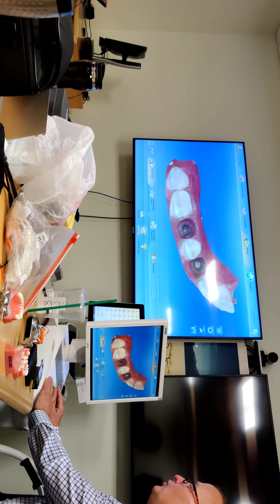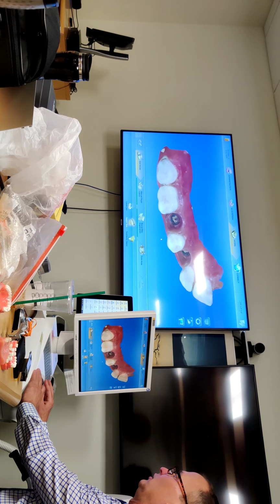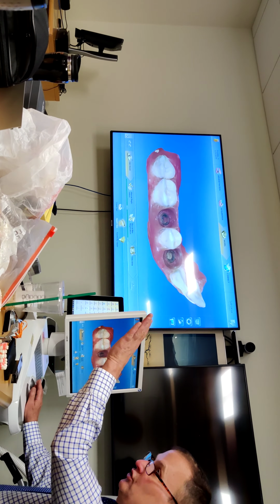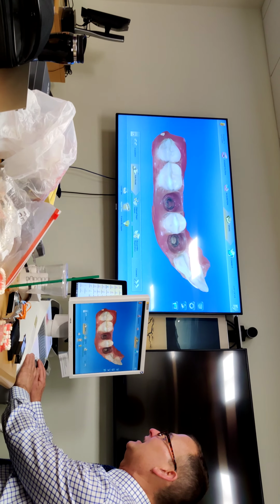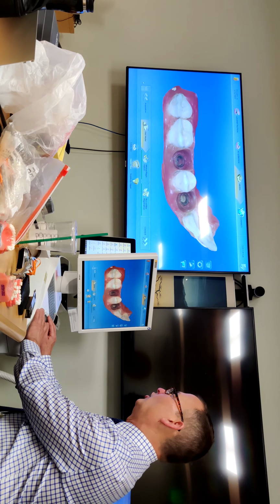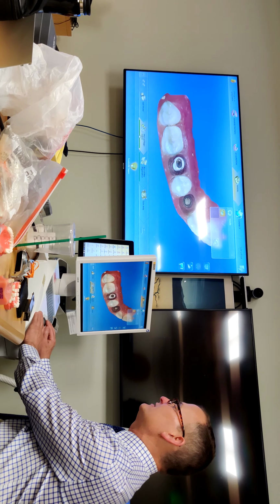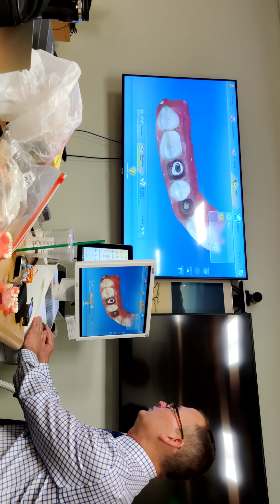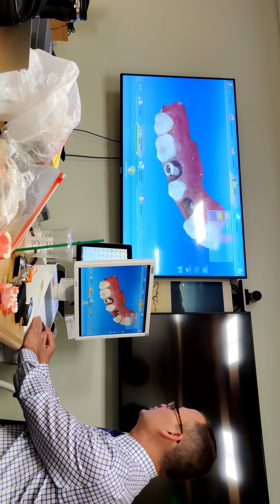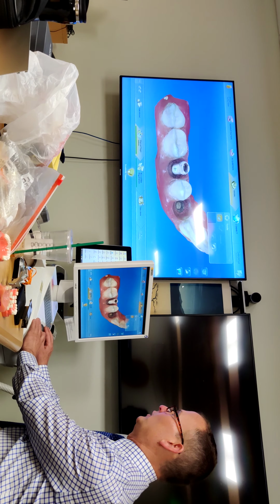Edit model. We don't have to do this, but you can. Look how great that model looks, huh? Okay, so to answer your question, if you want to see something that you can't see, this is the expansion thing. Now, it's not really expanding anything here, or condensing. So manual registration, if it's not showing up, expand it. So here's manual registration. We don't need to manually register it.